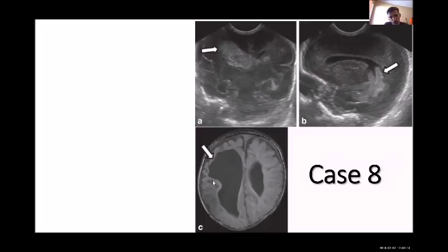And I think this is MRI. There is a dilatation now and atrophy of the brain, getting bigger in size. It does not look like hydrocephalus to me, but I might be wrong, because there is no shift. It can be hydrocephalus, but it's due to atrophy of the brain, not a tension hydrocephalus. Even if it's hydrocephalus, it's communicating because there is no shift.